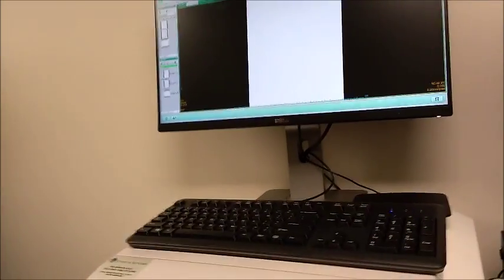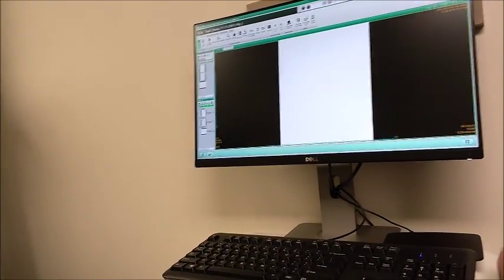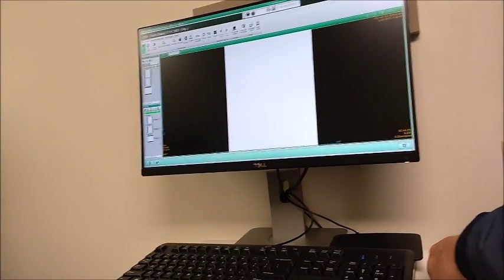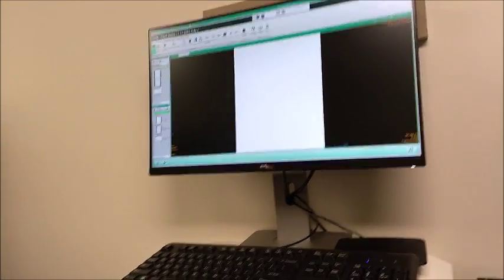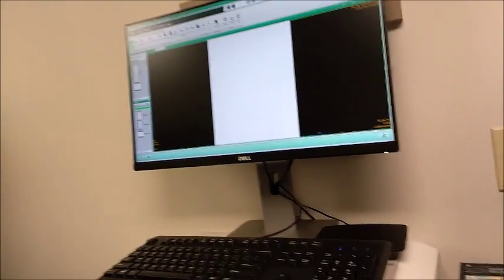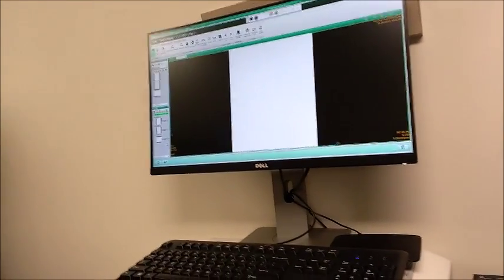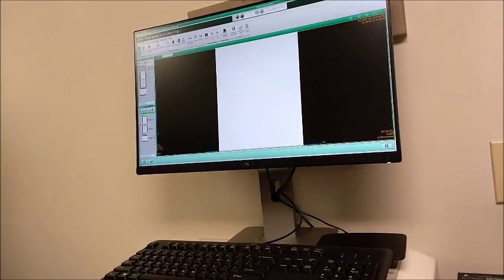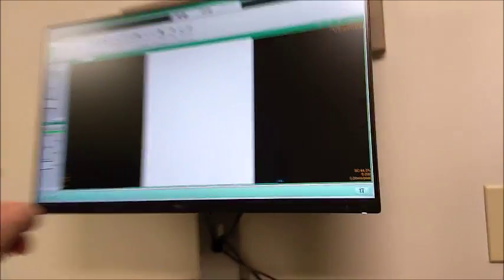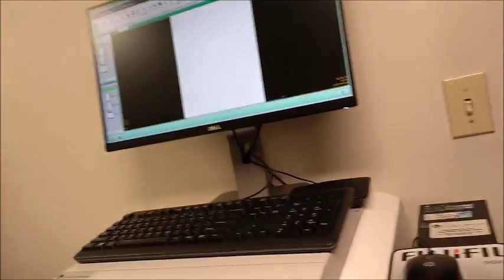Now, of course, if the vet comes back and says, I need one more view, then that one wouldn't have been transferred. I mean, it's not foolproof. We just have to use our brains. Well, if the vet comes over and says she needs one more view, you would have to add that view, do it, and then go back in here and just pick that image, select that one and send that out. Right, exactly. Select that one, not the other one.